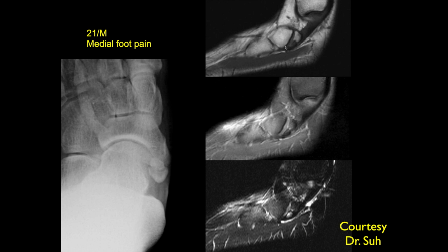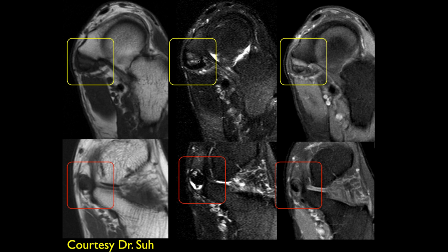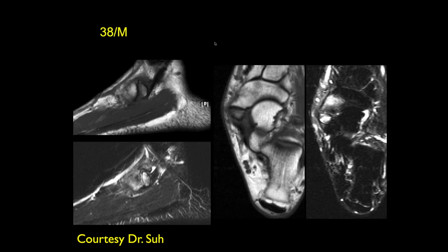The navicular is nice and smooth here. So I meant this is the fracture type 2 of the os. This is probably a fracture of the os, right? Right. Which we can see here. And then, here are the axial images. Yeah, and there's actually some posterior tibialis tendinosis as well. Yep. Here. Okay, good. Jennifer.